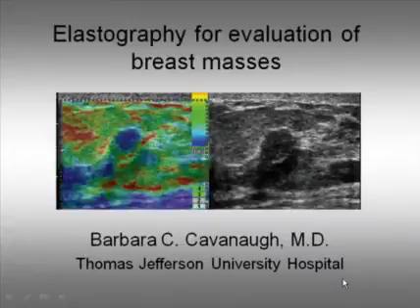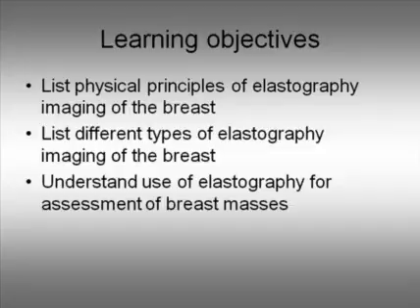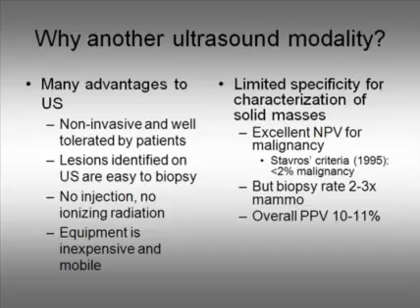Elastography for evaluation of breast masses. The learning objectives, what I'd like for everyone to take away, is an understanding of the physical principles of elastography imaging of the breast. There are different types, and I'd like everyone to understand how we might use elastography in our assessment of breast masses.